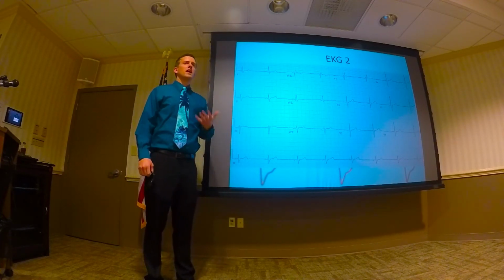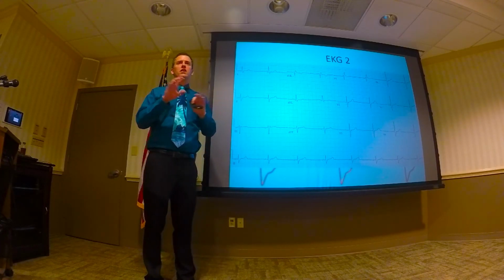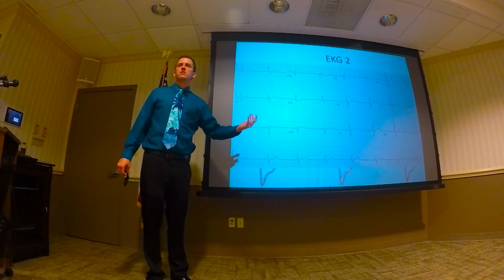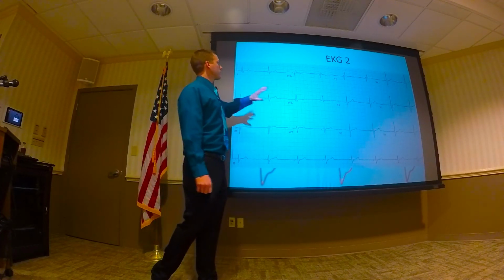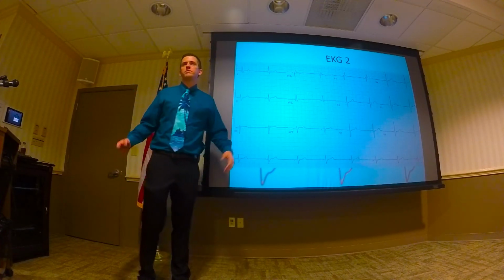But when we read an EKG, we don't write everything out and say there's a 99.9% chance it's sinus rhythm and a 0.1% chance it's not. That would be silly. So what you're doing is hedging your bets. You're looking at what you think, what you've seen before, and saying, based on what I know, this is a right bundle branch block, this is ectopic atrial, but there is that small chance it could be something else. Yes?